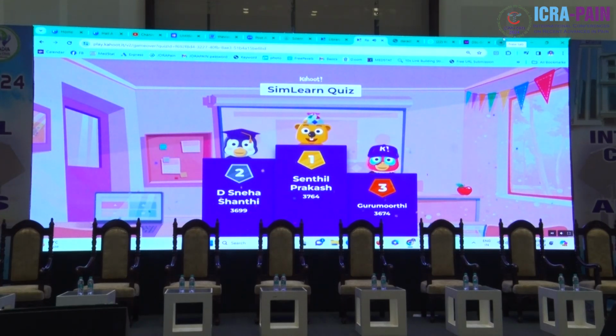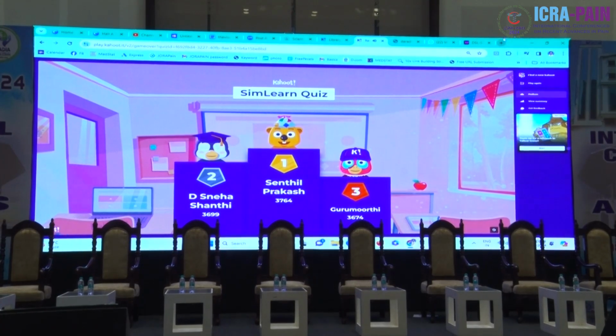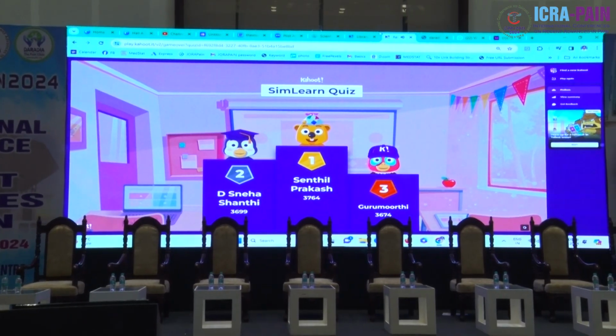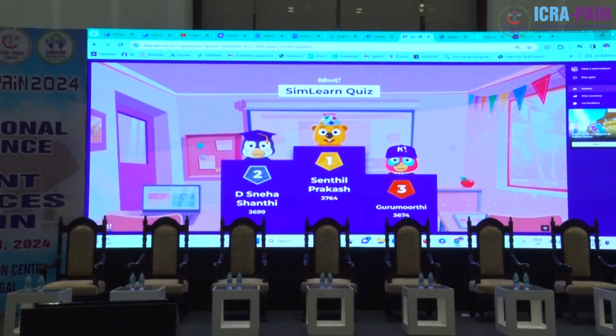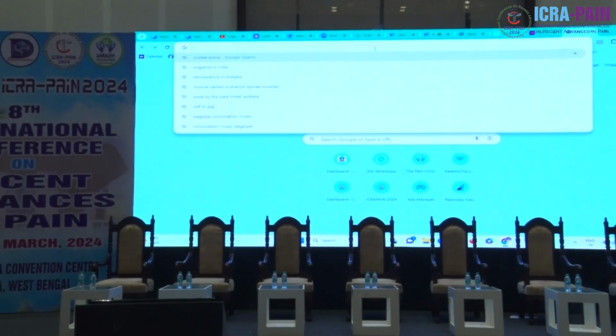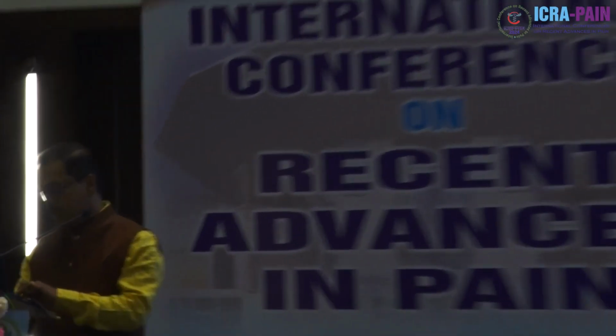But right now, those who have a laptop, open it and we will be starting the USG simulator now. So those who have a laptop, first you type, I am typing it here, you also type Daradia SimLearn, DARADIA SIMLEARN.com. So, DaradiaSimLearn.com.